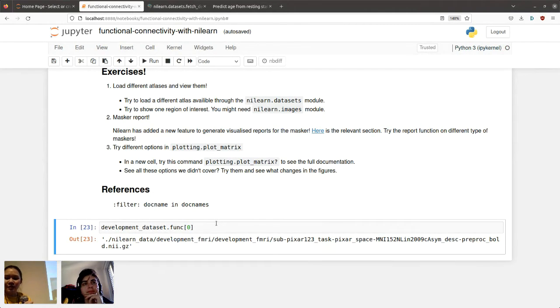So there's a follow-up and additional explanation kindly from Pierre for those folks who are online. In Nilearn, there are also very cool functions. You can define your own functional atlas from your own data, so you don't need to use the preset ones provided from Nilearn datasets. There are multiple options.